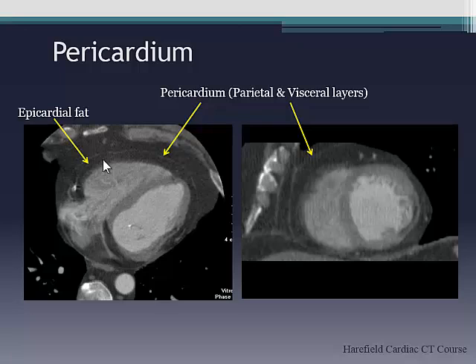So sometimes if you've got what looks to be fluid on CT, you're not quite sure because it's difficult to measure the Hounsfield unit, then MRI can be helpful if you're trying to distinguish whether it's pericardial thickening or maybe some fluid. So always with pericardial disease, I always say you should do a CT and you should do an MR and use the information together, obviously together with echo.